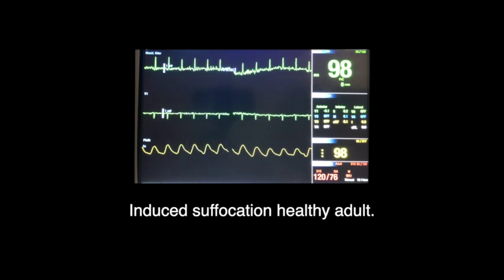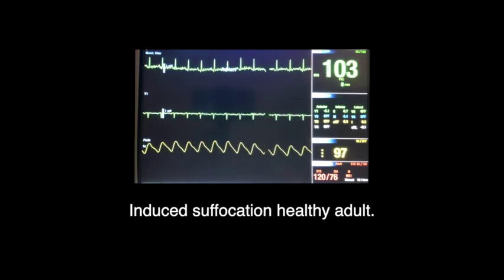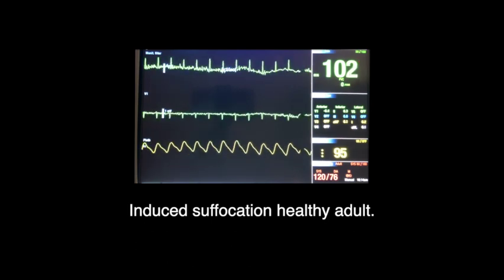This is the heart rate and SpO2 fluctuations of an induced suffocation and relief of suffocation in healthy adults.